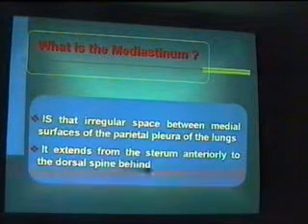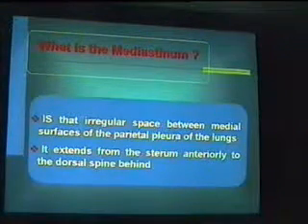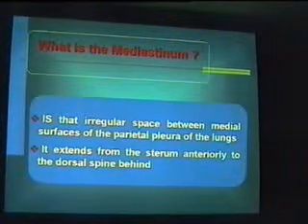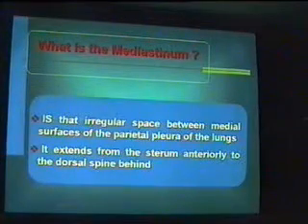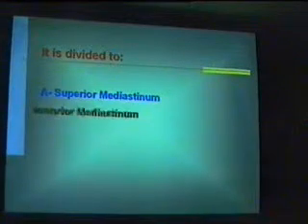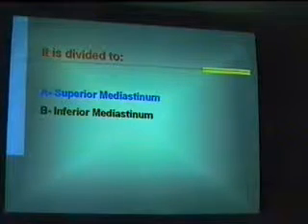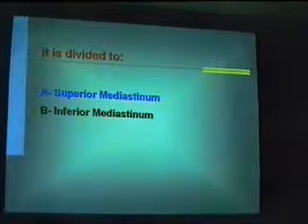Where does it extend from? من فين لفين؟ من الsternum anteriorly backwards لغاية الspine. تحتل كل الجزء دي. طيب لما نيجي نتكلم عن mediastinum we better divide the mediastinum عشان نعمل better localization for any lesion arising from this mediastinum.